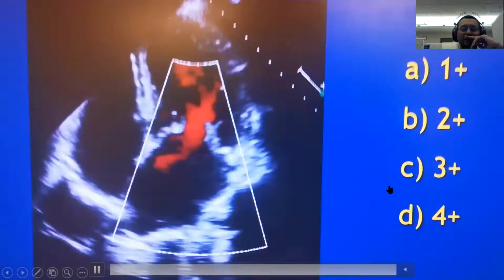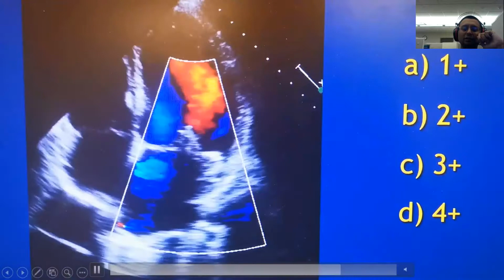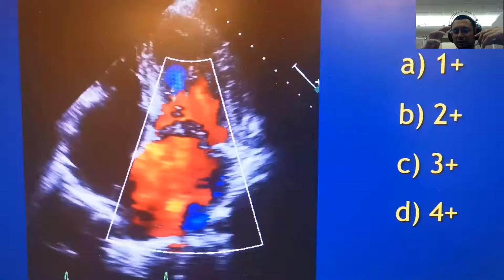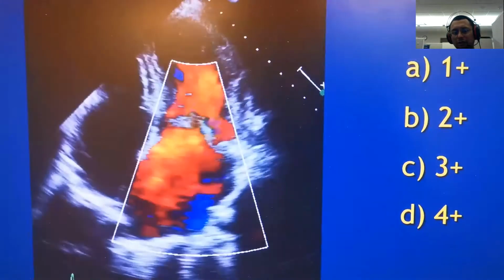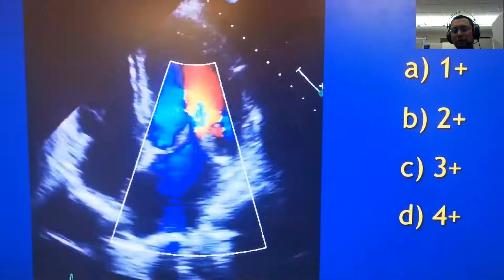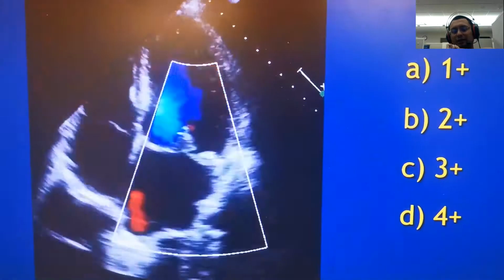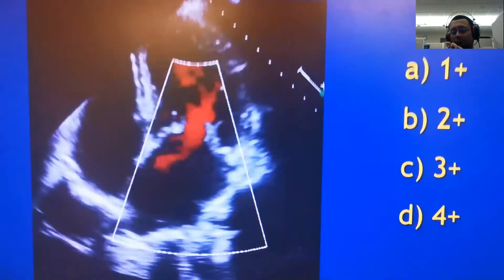duration of the mitral regurgitation. Is it long or is it very short? Even though the jet itself is big, what about the duration, do you think? Is it long or very brief? Brief, I mean, it's quick. It's quick, right? But the color reaches the pulmonary vein.